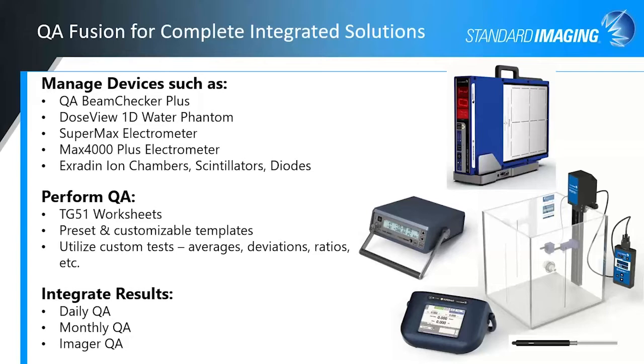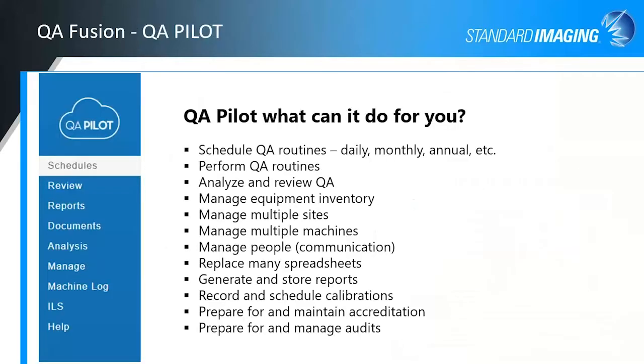Well, in QA Pilot, you're already doing your management of devices with a nice dashboard overview of those things. In QA Pilot, you're also able to perform TG51 worksheets built into the QA Pilot platform. We have preset and customizable templates, and we have a variety of custom tests that you can utilize that include some mathematical functions like averaging, calculating deviations, and ratios. And we're integrating your results from your daily, monthly imager QA. This is just the beginning, and we've got more to come.